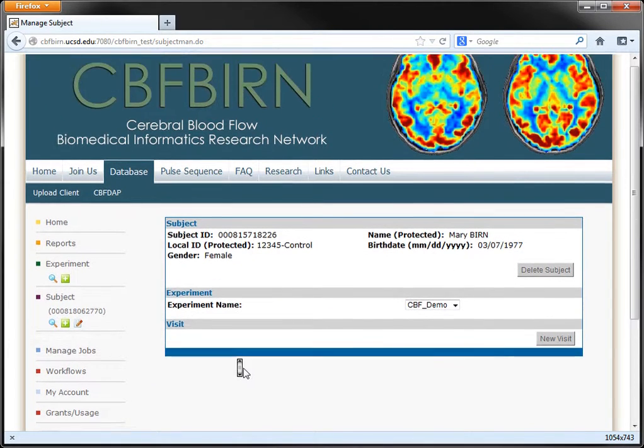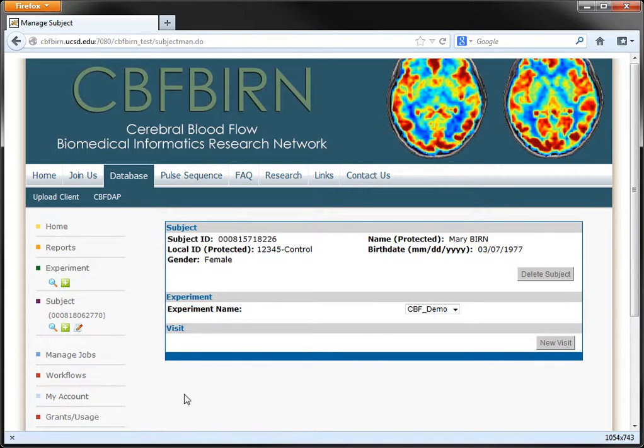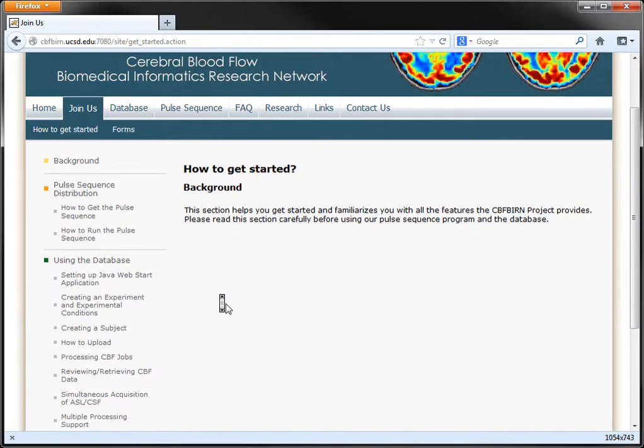In the next tutorial, we will actually upload some ASL data from a local computer to the database and associate the upload with the subject IDs we just created. For more information on the steps discussed in this tutorial, please click on the Join Us tab and select the Creating a Subject link.